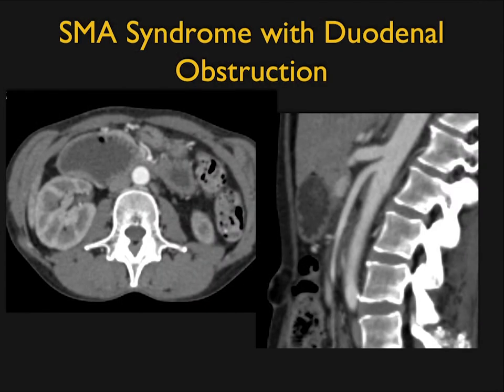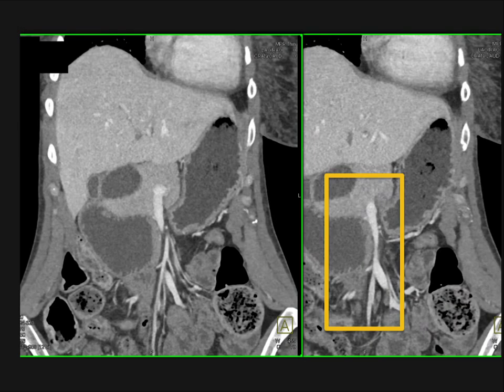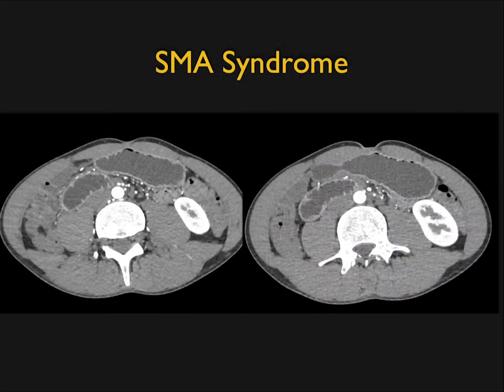And one last example, again, distended duodenum right in front of the aorta by the SMA, and then you see it on the sagittal view, and you can see very nice transition, nicely on the MIP, the transition by the patient's SMA, which you can see there. And then again, if you look at things in multiple views, classic presentation of distended duodenum transition right by the aorta, SMA junction. Very nice example axially or on the coronal views. And on the coronal view, it also gives you the sagittal view in 3D. Very nice example. And here's another case, same thing.